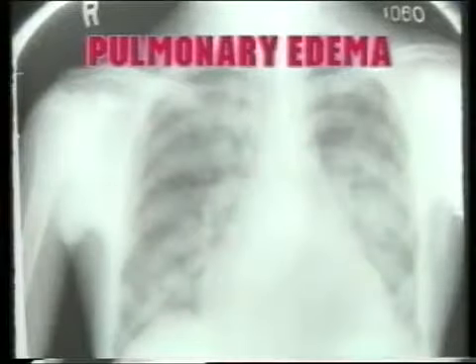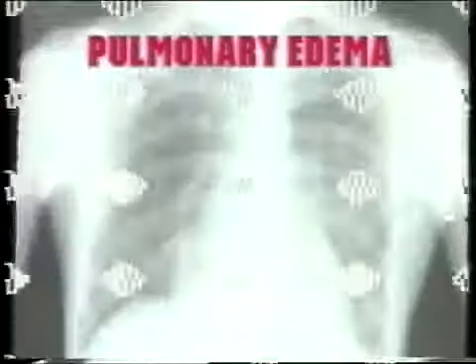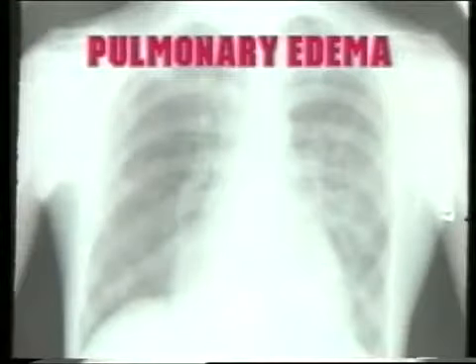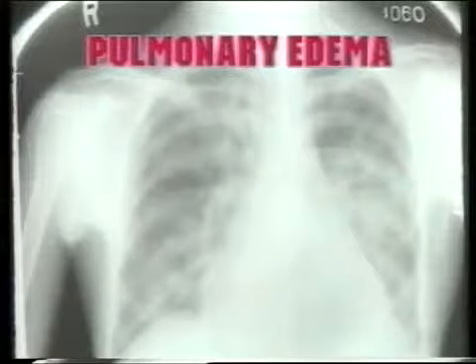This is another set of 2 X-rays. In the first X-ray, note the cardiomegaly with patchy consolidation in the mid and lower fields. And the second X-ray, after 1 week, shows complete clearance of the lung fields. This rapid vanishing of the consolidation with diuretic therapy is another characteristic feature that reconfirms the diagnosis of pulmonary edema.